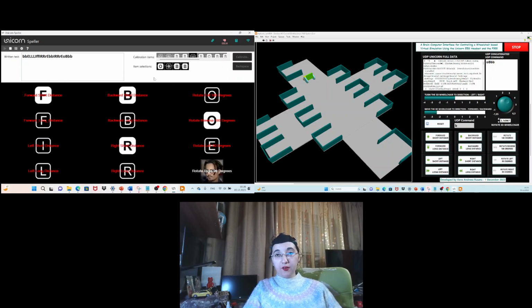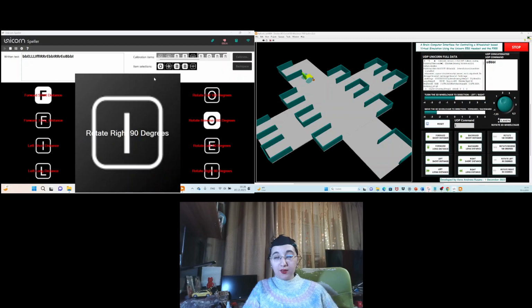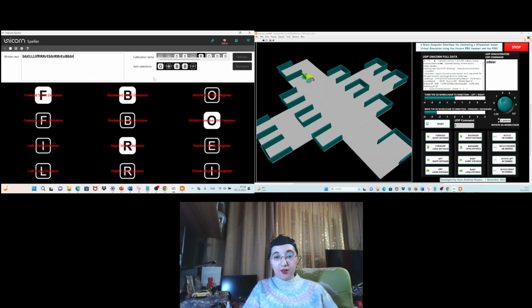Rotate right with 90 degrees. That's really nice. Then let's continue with the next command. Right short distance.